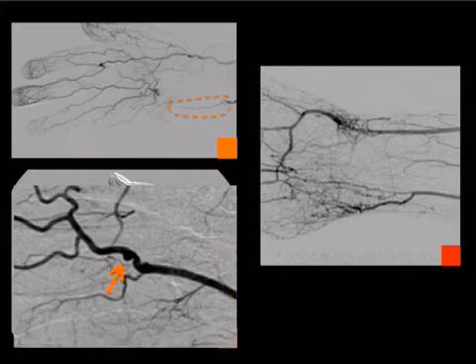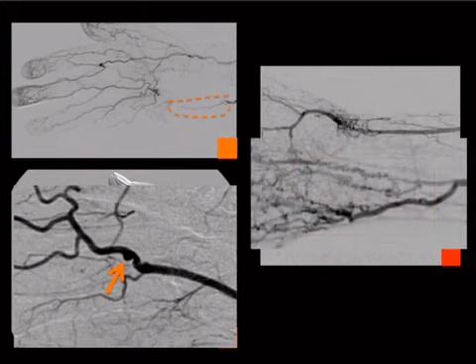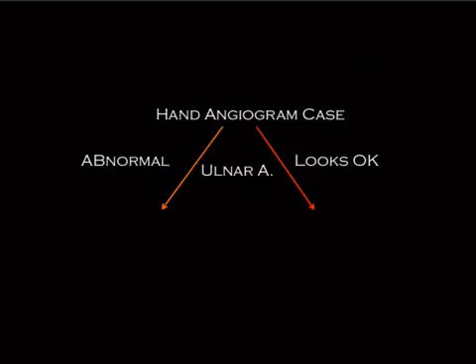Now, both of those processes were affecting the ulnar artery. Okay, so that's a key point. Now let's look over here to this red guy, and you'll notice that there's a bunch of corkscrew collateral vessels. So this is different. So what we've got is corkscrew. See those guys?